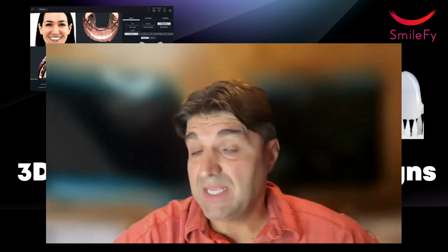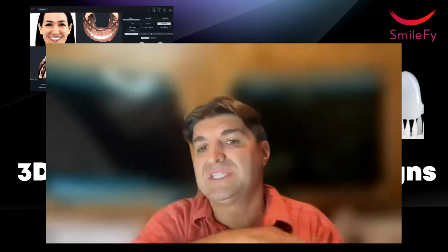Can you print each mockup detached from the model and one base model? Yeah. So what we can do is close the meshes. If you have an open mesh, we close the meshes, we set the base, we can do all this stuff, and then you can print the intraoral scan, and you can print only the design, like temporaries.